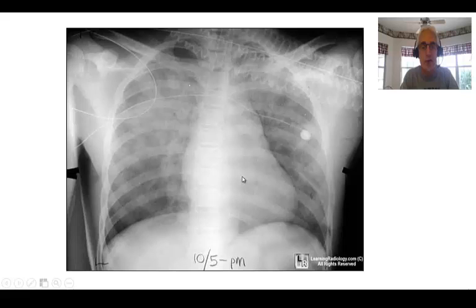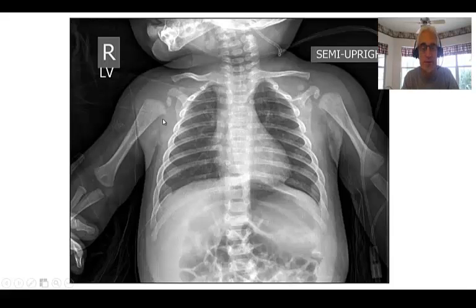Now here's a patient who presents with shortness of breath and respiratory failure. This is pulmonary edema. I want you to see the pattern, these bat wings, if you will, of pulmonary edema, fluid in the alveoli, in the interstitium. And this is pulmonary edema. Notice that the diaphragms are spared. There's no effusion, but it's the interstitium that's just clouded with pulmonary edema.